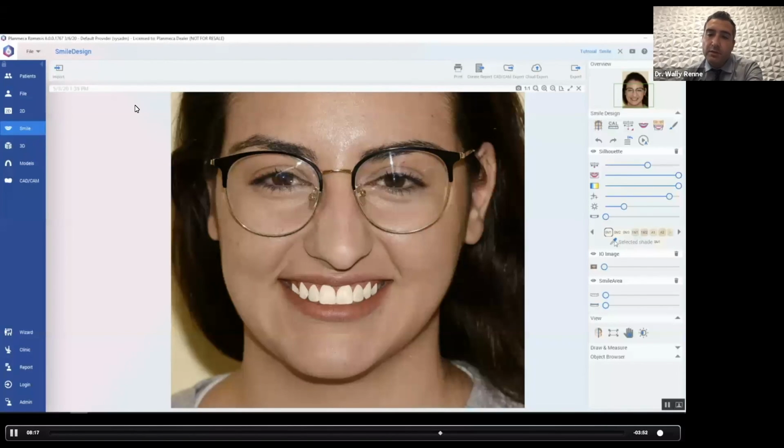And we could get them to look ultra realistic. I'm going to show you that in a minute. You could change the color. You could change the opacity and things like that. Here we're going to decrease the chroma a little bit. And you could brighten and darken as much as you want. But there's a way to make them look ultra realistic if you wanted to. We'll go through that. But I don't like to do that. I like to just do these kind of cartoony silhouettes.